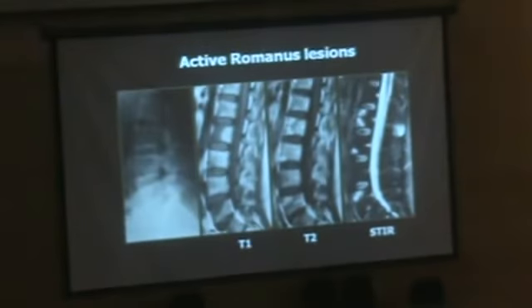So I'll show you some examples. X-ray sometimes is very difficult. What we can see are very subtle changes in the anterior corner. You see, it's really mild sclerosis in some anterior corners. This can be called unremarkable, a normal X-ray.